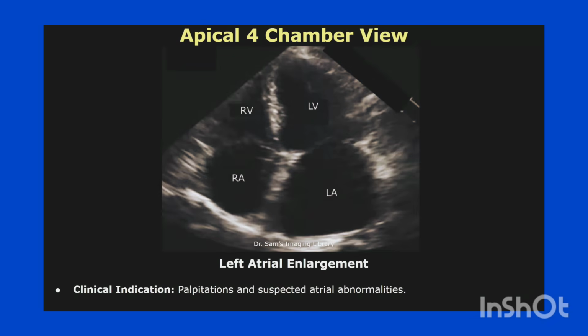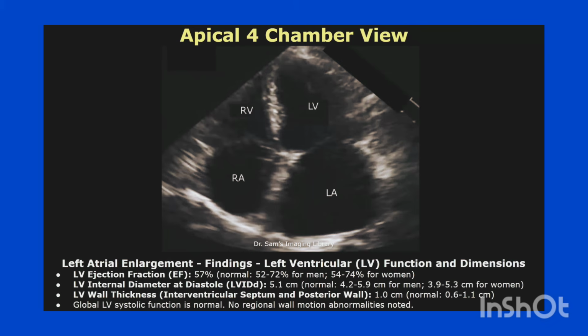Here is a case of left atrial enlargement. Clinical indication is palpitations and suspected atrial abnormalities. Here are the findings of the left ventricular function and dimensions. Ejection fraction is 57%.